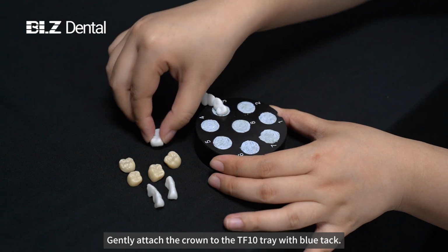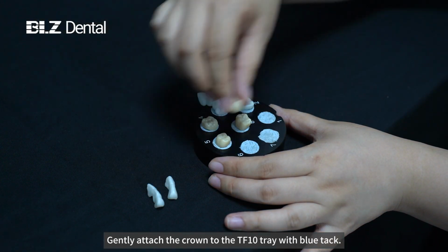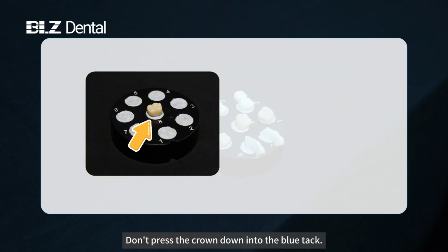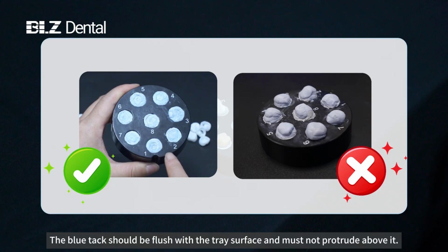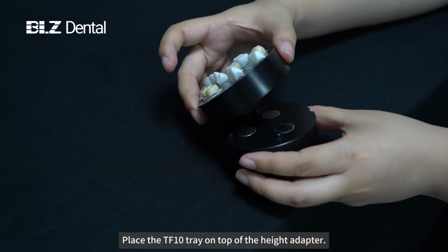Gently attach the crown to the TF10 tray with blue tack. Don't press the crown down into the blue tack. The blue tack should be flush with the tray surface and must not protrude above it. Place the TF10 tray on top of the height adapter.